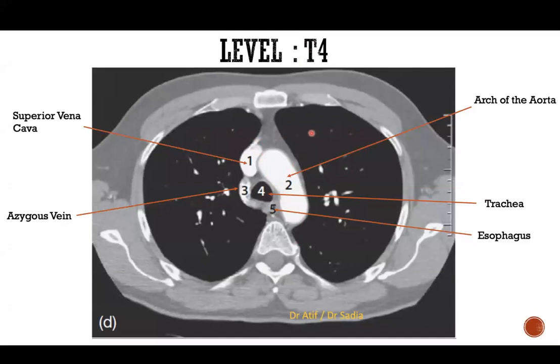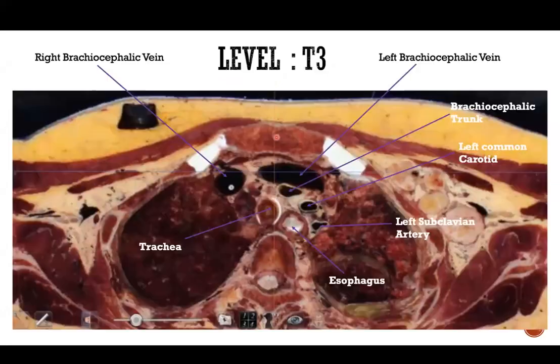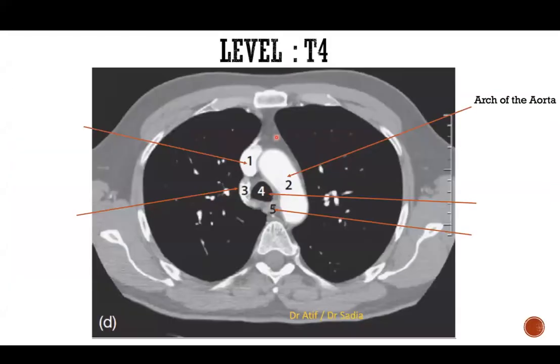You can't say I'm at the sternal angle yet, because what did we see happens at the sternal angle? The end and the beginning of the aortic arch. So if I take a slice at the sternal angle, then I'll see two arteries, the ascending and the descending aorta. I won't see one full artery. I'll see two. Okay, and so all the structures here are clear.